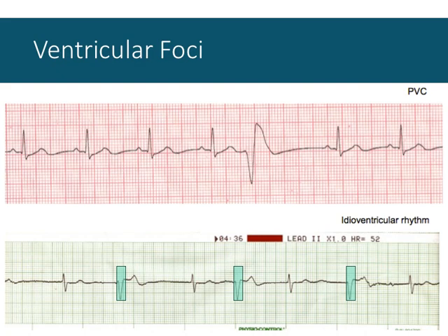A characteristic of these kinds of waves is we start to see a widening of the QRS complex, or of the premature ventricular contraction. We still see some normal QRS complexes here that are thin, that are regular, that are closely related to the T waves, and in most cases P waves. But these PVCs start to widen. And the widening is indicative of the electrical signal traveling through the muscle tissue itself.